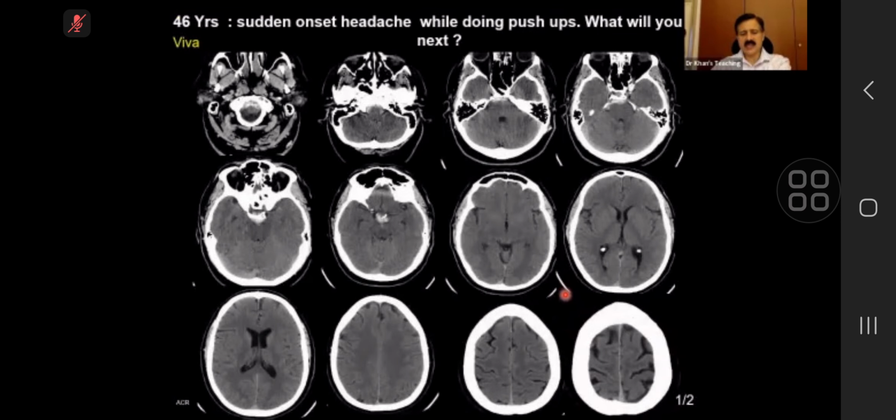Now, this is a case of perimesencephalic subarachnoid hemorrhage.